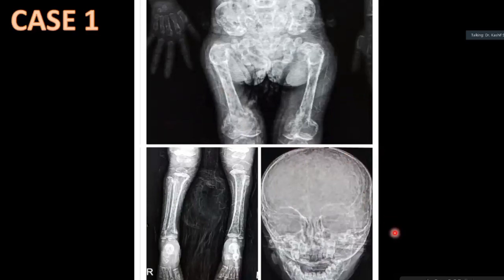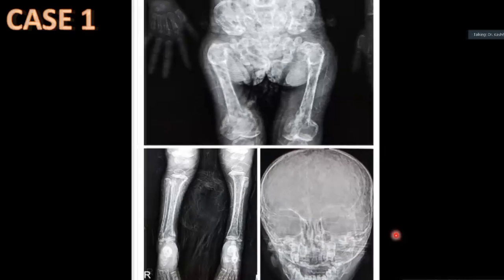So the first differential diagnosis for this imaging appearance would be metastatic bony deposits from neuroblastoma. Another differential would also include metastasis from some other primary malignancy. For further workup, we will do imaging of the chest and abdomen, CT with contrast, to find out the neuroblastoma origin and to find the primary.